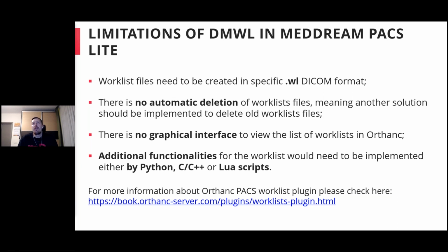And there is no graphical interface for the Orthanc worklist. As you saw in the PACS Premium, we were able to see the worklist in the user interface. We can actually even delete or edit the worklist. With Orthanc, you cannot see the worklist in any kind of graphical interface. That's why we use the SendToPACS tool to check the worklist and see how it looks. And these additional functionalities which you might need for the worklist would need to be implemented either by Python, C, C++, or Lua scripting.